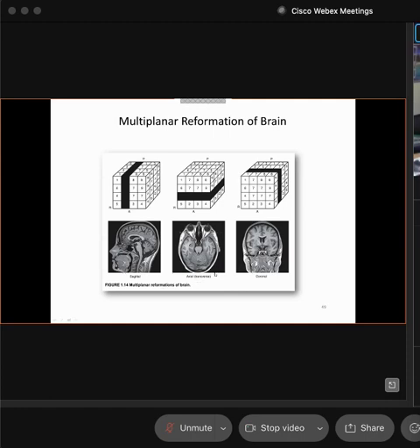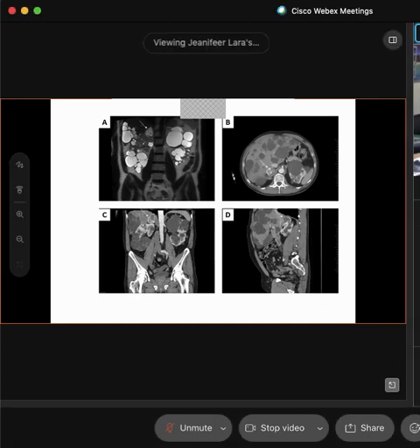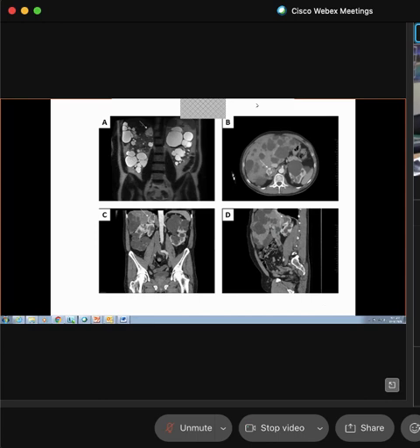Okay, good, perfect. So what we're going to pick up today and what we're really going to concentrate on is looking at different types of images, making sure that you're ready for Wednesday's exam. So I want someone to tell me what kind of image is A. Matter of fact, I want you to type it into the chat. I want everyone to type it in.